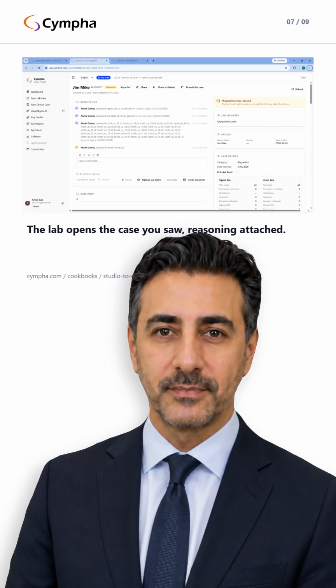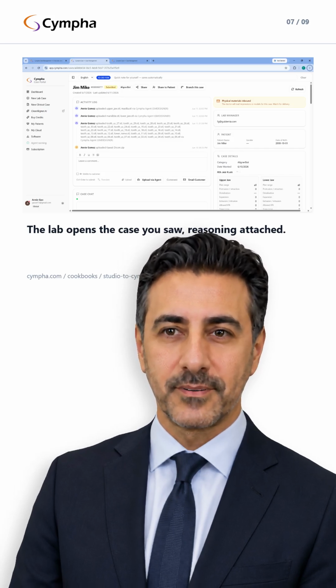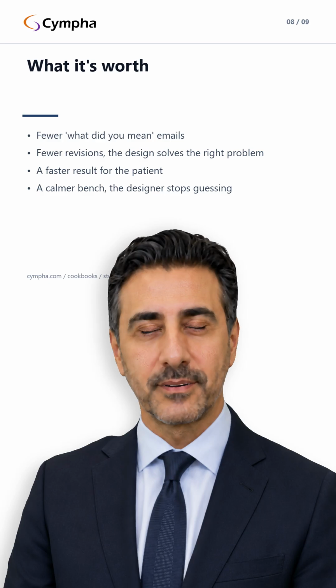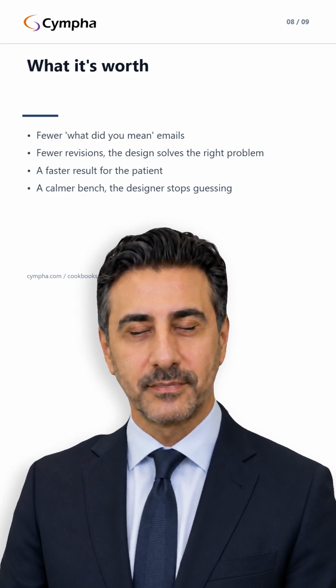On the other side, the lab opens the case and inherits both things at once, the patient and your understanding of the patient. Every file, mark, and status change is written to the case's own history, so months later anyone can still see who added what. Everyone works from the same patient, and no one can quietly change it.